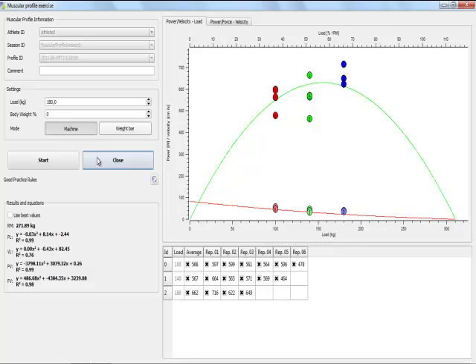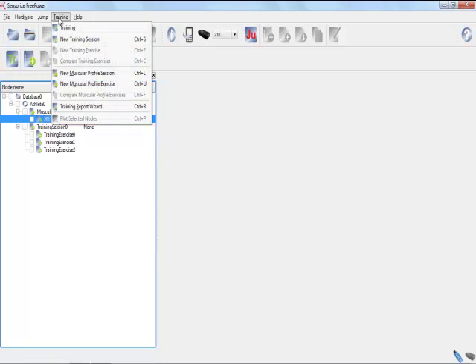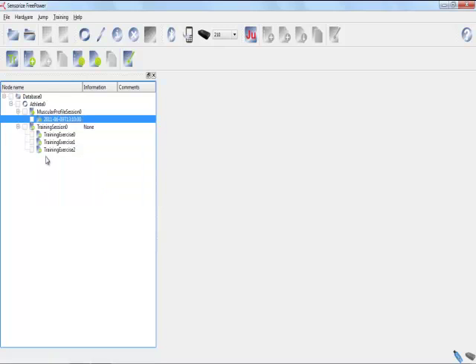When more than one athlete has to be evaluated, the user can take advantage of the resting period between a series of repetitions and the other to start to acquire another athlete. The user can close the current acquisition window anytime he wants, even if the minimum required number of 3 series of repetitions has not been reached yet. The user can open the muscular profile exercise in modify mode and continue to acquire data or modify the existing muscular profile exercise.